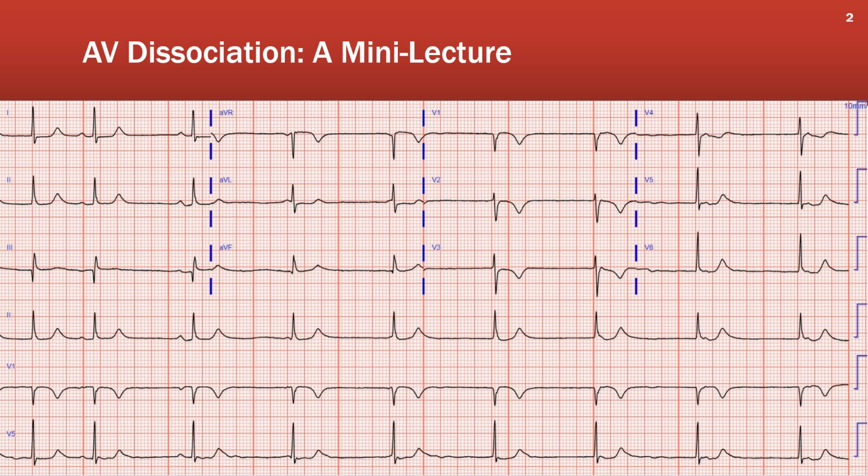This ECG is from a former student of mine in the Masterclass in Advanced Electrocardiography that I presented in London a few years ago. It was recorded after CPR, and the serum potassium at that time was 5.8. While the T waves are symmetrical, they're not at all like the tall, pointed T waves of hyperkalemia. However, those classic, even iconic T waves are present in only 22% of cases of hyperkalemia. I have no information regarding whether or not the blood specimen was hemolyzed. I'll get to the point.